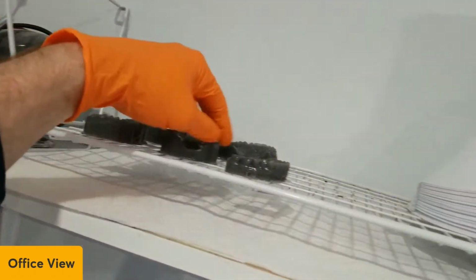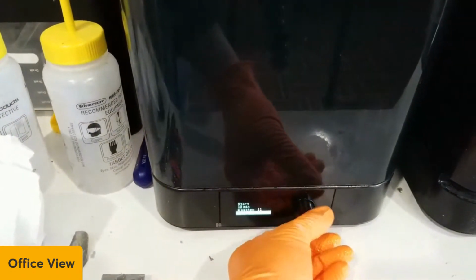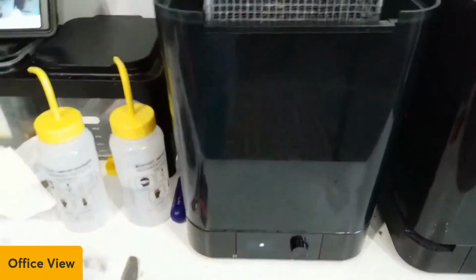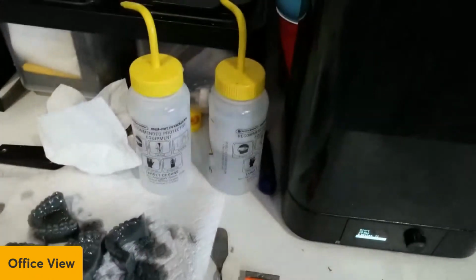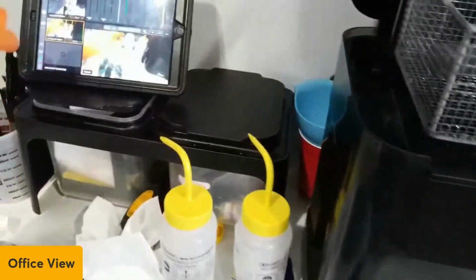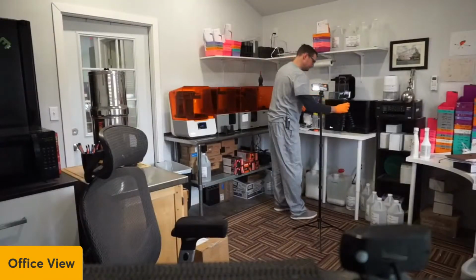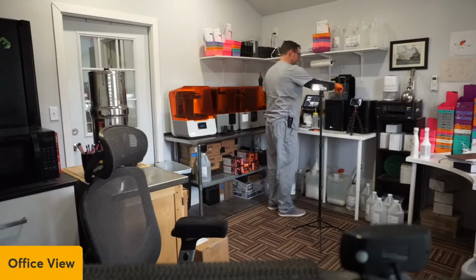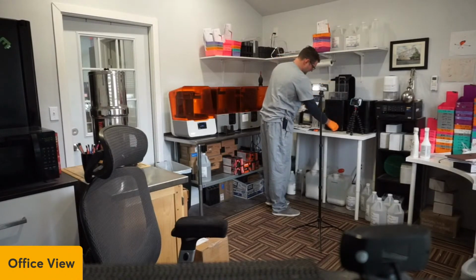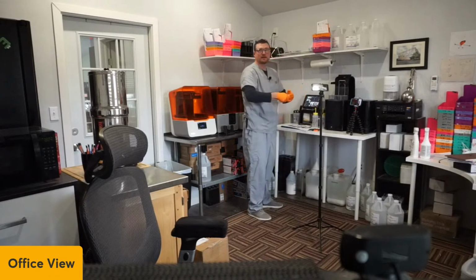And we'll let those dry a few minutes, and then we'll put them in the cure. And I set this to sleep. Oh, wait, I didn't want that. Yeah, I got to put these in there. So then I just go to the next step. Put these in here. Let me see if I can do this with a different hand. So I'm just going to put these in here, and start. And that lowers down and starts doing its thing.